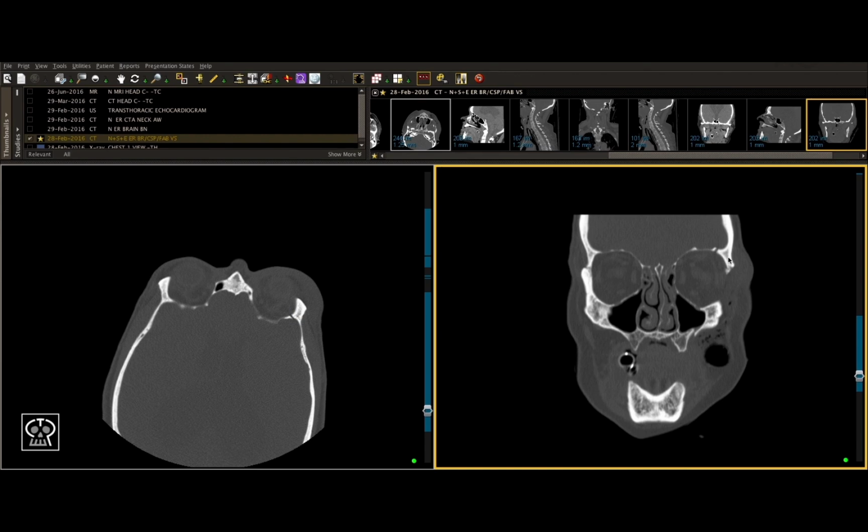So at this point, you're thinking we have fractures of the anterior and posterior lateral maxillary sinus walls, fractures of the zygomatic arch, as well as a lateral orbital wall fracture. All of these put together represent a ZMC type fracture pattern. We also noted a superior orbital roof fracture and a greater wing of the sphenoid fracture, which is what we saw on our axial scan previously. At this point, we'd be ready to diagnose this patient with the left ZMC fracture, as well as a superior orbital roof fracture on the left side and a greater wing of the sphenoid fracture on the left side.